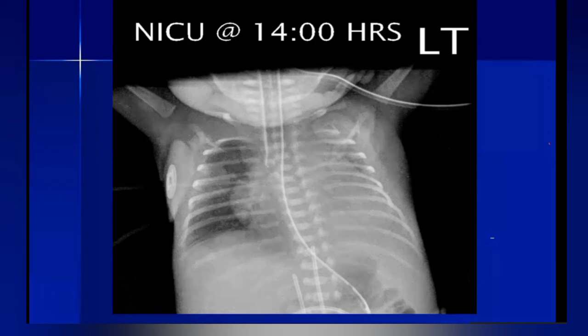And sir, there is the right lung as compared to the left. The right lung shows some normal lung parenchyma, as you have already told, that it is responding to the therapy. Sir, the left lung is showing opacity, maybe there is some mucus plugging due to some obstructive pathology.